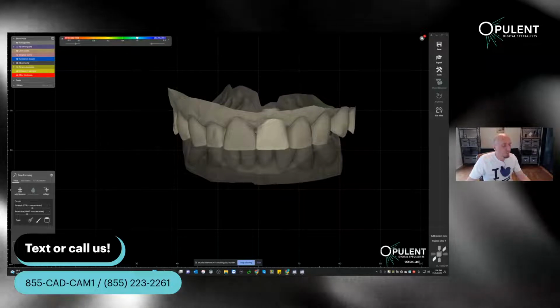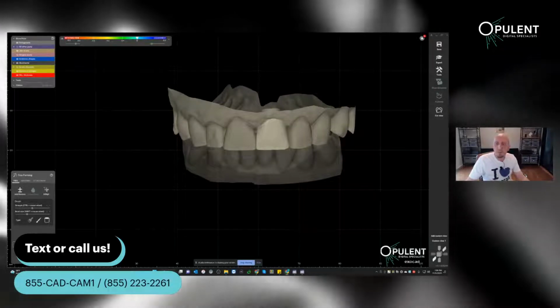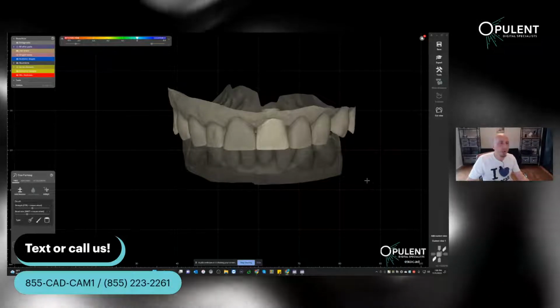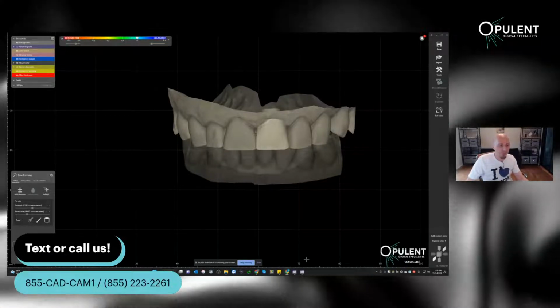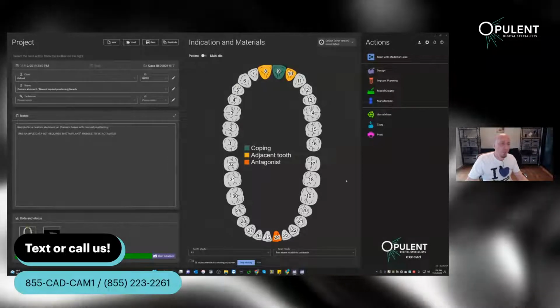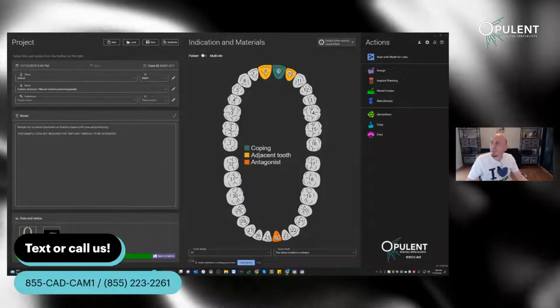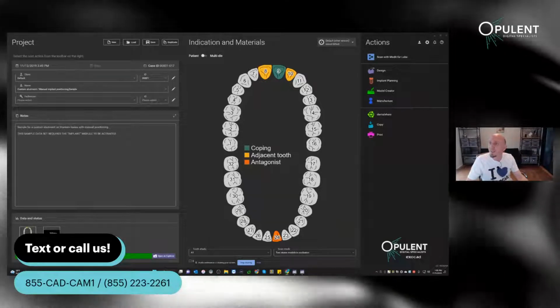So today, software, not anything else. And I will start this case over here for you. So what are we looking at? I'm going to open the chat window. I think there is a message here. Yes.